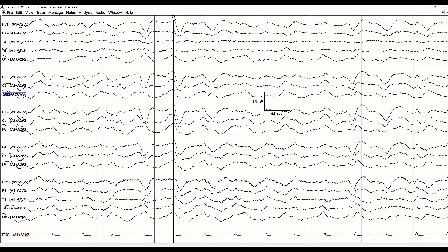Okay, so right now, if we just look at F3, we can see the peak of the first upward deflection. And there's not so much a lag that's as salient with the frontal electrodes in this initial upward deflection. But nonetheless, there is one there. I think it's easier to see, or more salient, if you compare this F3 to CZ. CZ is just a little bit lagging behind. And then finally to PZ.